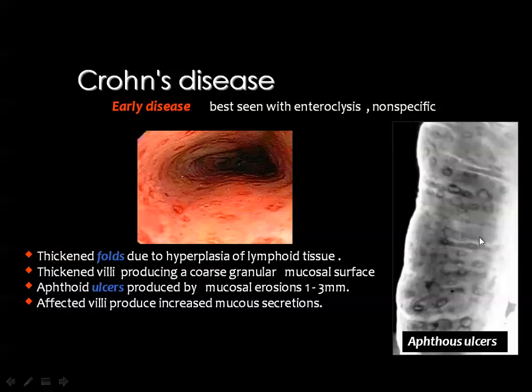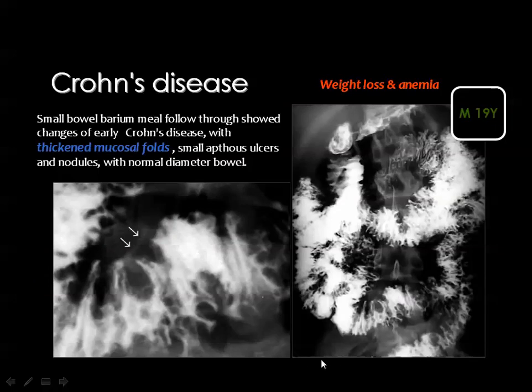You can see ulcers like this in the stomach in cases of erosive gastritis, where there is a flake of barium which is surrounded by a radiolucent rim representing the mucosal edema. Then the thickening of the mucosal folds, as I have mentioned, is due to lymphoid hyperplasia. Then you can see that the mucosal folds are extremely thickened, and you can see it here in this magnification view.